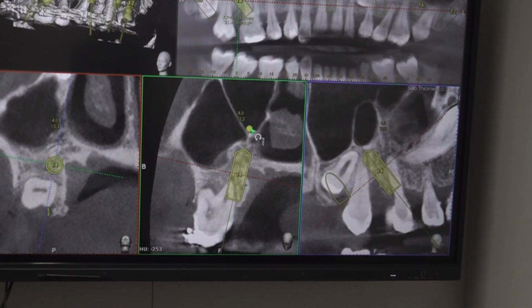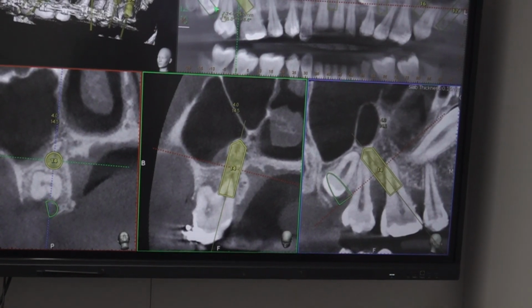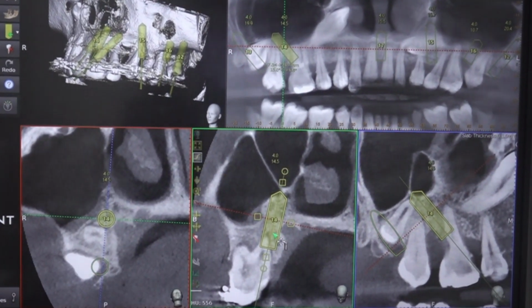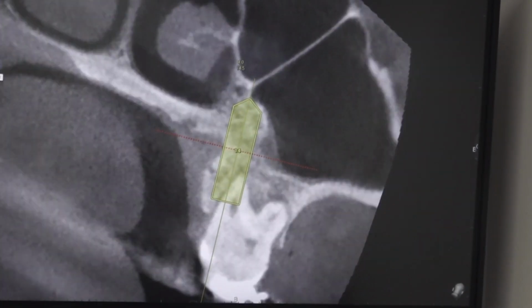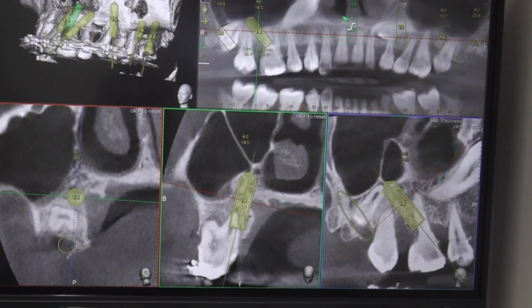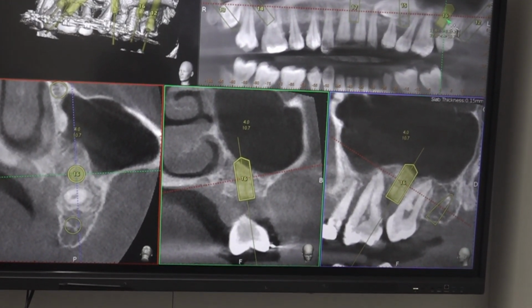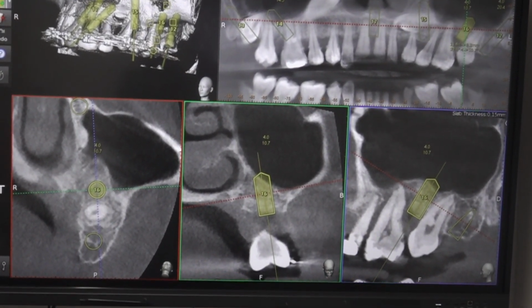That is also possible. Actually, this kind of bone won't be present, but here it is present. So one pterygoid and one more. It's a kind of palatal bone from 6 tilting distally. Okay, so almost like 2 pterygoids here. So totally how many implants now? Leave this molar implant, 5. Left side 3, including the middle implant, right side 2. One implant we need in the premolar areas.